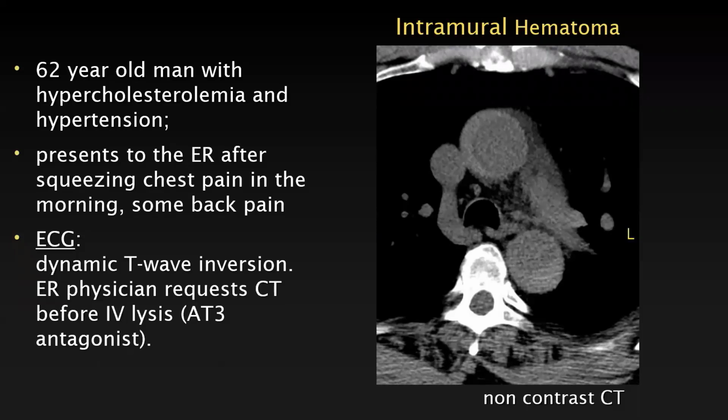And we've seen these images yesterday, and the hallmark is again that you have a crescent-shaped zone within the aortic wall, which is hyper attenuating relative to the blood pool. So the blood pool is always lower in attenuation than fresh clot. And the reason is that fresh thrombus doesn't have too much iron in there, and that's why it's hyperdense, which is what I thought initially. But the reason why clot is hyperdense is because it's concentrated hemoglobin, essentially. You have a high protein concentration, which gives it a higher attenuation on CT.